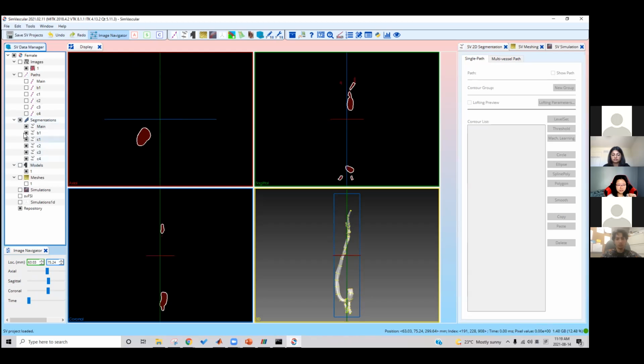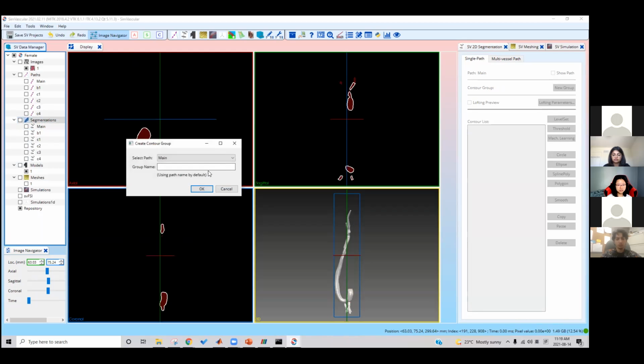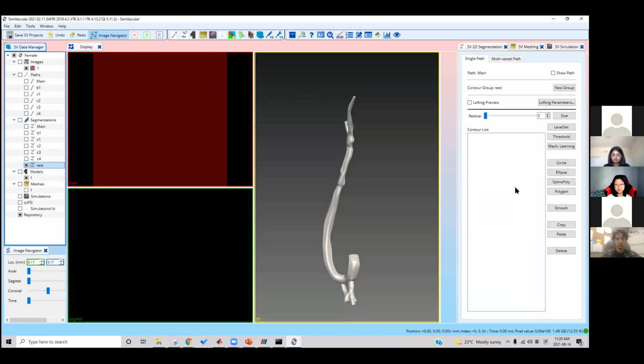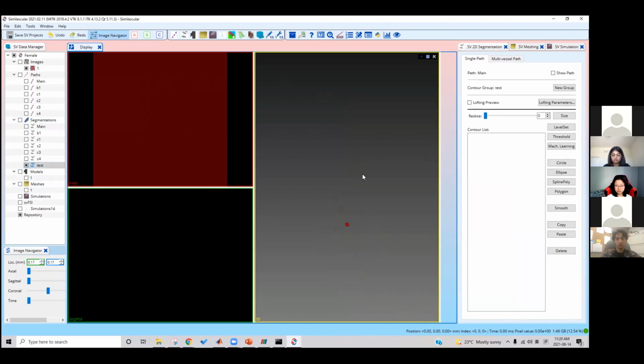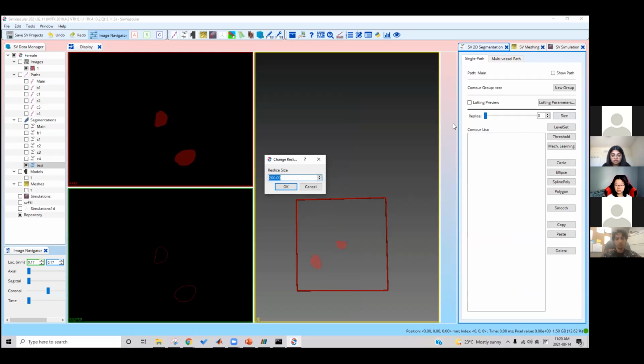Okay, back here. One of the things you might run into is that sometimes it's going to look like this, and nothing works. So what you have to do is observe the cross section. What's happening is that the size is either too big or too small. So you're going to test it out to see. Okay, let's try that. Okay, so this is too big now.